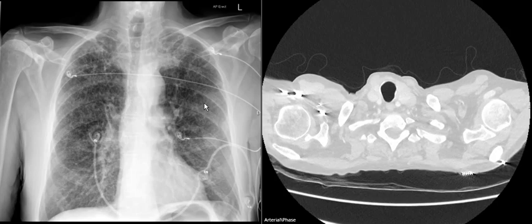So I want to just go through a few things that you'll learn when you start looking at a CT scan from the same day that you get a chest X-ray, so that you can actually differentiate certain structures. So let's just go through the basic process with this guy here. He looks reasonably square on. Clavicles are either side of the teardrops, which are the spinous processes, and the trachea is all in the middle.